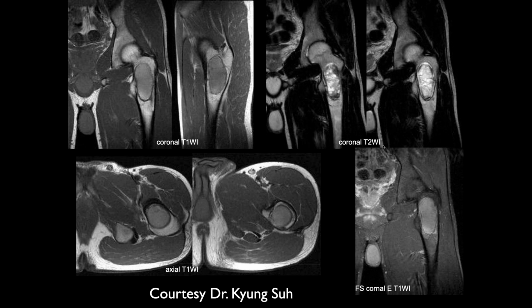So on MRI, we see this kind of heterogeneous circumscribed lobulated lesion in that trochanteric region. Again, the cortex looks intact. And I'm trying to think. It's not really fatty tissue within there. Like there's maybe some fat, but when you look on the T1s, they're intermediate signal.